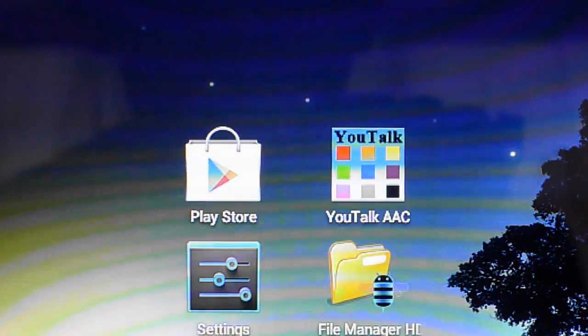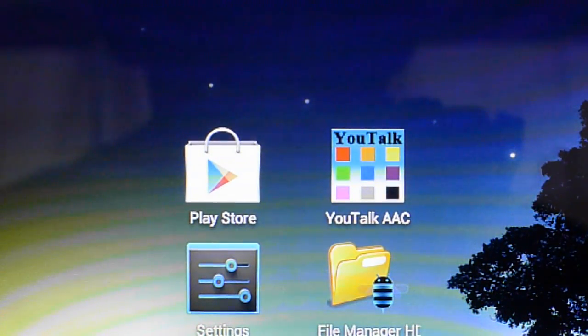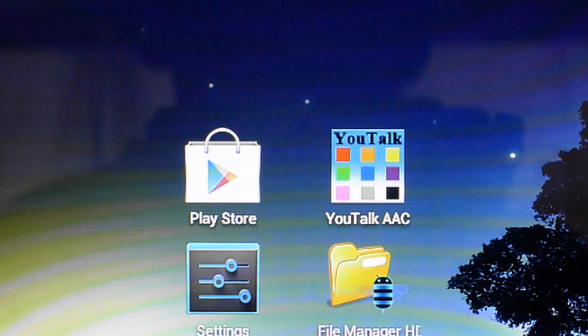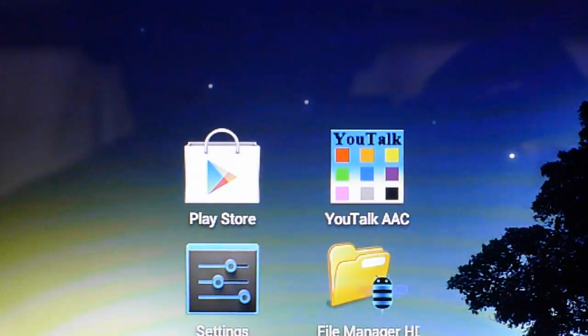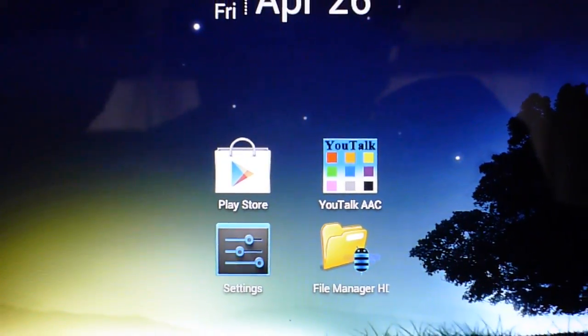Hello everybody and welcome to this demo and introduction for the YouTalk AAC application, the Augmentative and Alternative Communication. It's a grid communicator, speech communication application meant for nonverbal individuals or just anybody who'd find this of use. So we're going to go ahead and launch the application first.